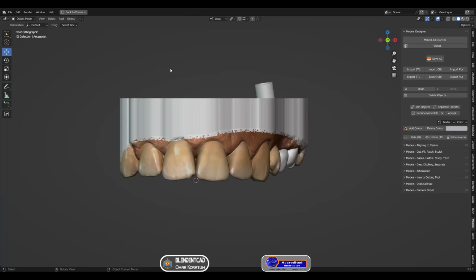Hello everyone. In this video, I'm going to show you how to get the infamous magic lantern into Blenderfordental. For those who don't know what the magic lantern is, it's simply a lamp that you can move around in the 3D viewport of any dental CAD, where you can see the small anatomies or micro anatomies of the teeth, but its main indication is to see the proximal surfaces, whether concave or convex, and adjust as required.